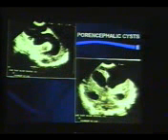Same thing, you can see the lateral ventricle, and it is seen communicating with the porencephalic cyst. This is the communication with the porencephalic cyst. Again, you can see this is a 2-month-old child. This is a dilated frontal horn. This is a communicating porencephalic cyst in a case of post-sequelae of meningitis.